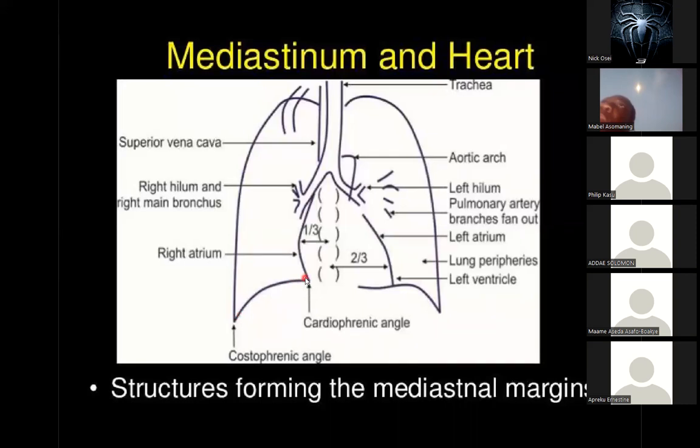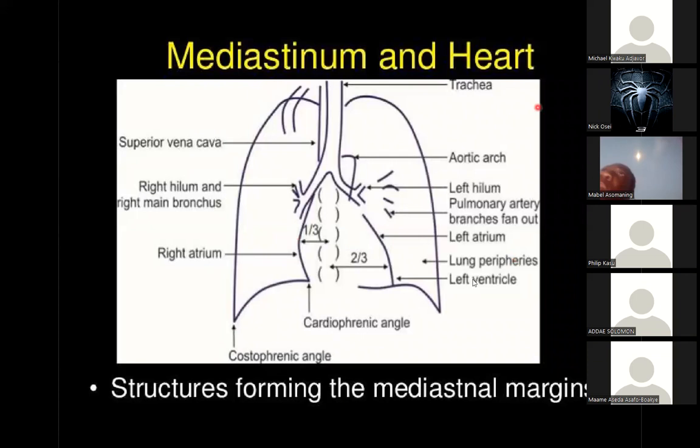All right. Now, the reason I'm particular about chest x-rays is because, as I've said, usually they don't come with reports. And so, because of how relatively simple they are, it's important that every clinician knows how to read them. Okay. All right. Now, so there's the mediastinum with the heart showing. Okay. So all these structures are there.